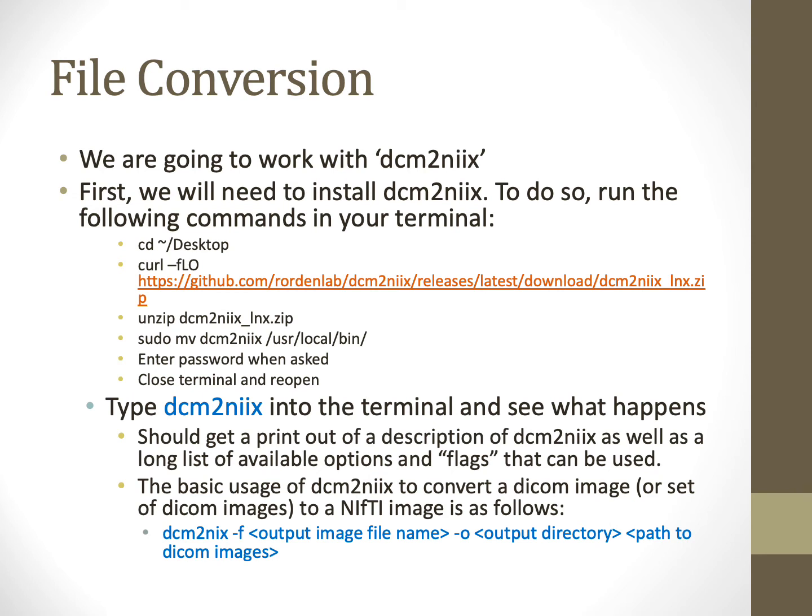The basic usage of dcm2niix is to convert a DICOM image or a set of DICOM images to a single NIFTI image. The following command provides an example of the basics of how to call dcm2niix to do this.